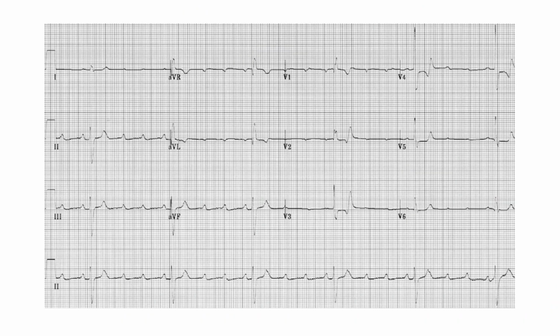So here, in this case, we will see again. Look at the P wave. This is the P wave, and this is the P wave. And definitely there will be a P wave hiding inside this T wave, which is not visible here. Again, this is a P wave. So from this you can understand the rate of the P wave. It is around two large boxes, so the atrial rate is around 300 divided by 2, around 150. Ventricular rate: see the ventricular rate. This is the RR interval. Sorry, this is a QRS complex.